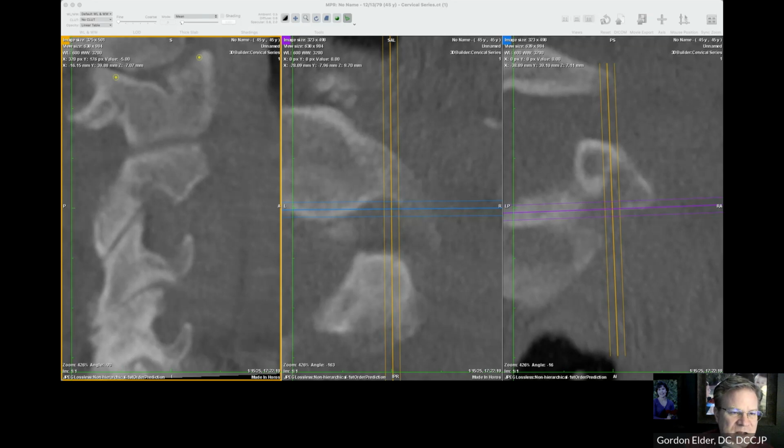Okay, Ryan. Sometimes the 3D on ours doesn't end up this crisp. I found it typically older people or people that are heavier set. Is there a setting on taking the CBCT that can change that? I've tried some experimenting with changing the voxel. So there are different sizes. Voxel is the 3D pixel that we measure the slices in. And you can change that. I try to get as detailed as possible. And the machine, like a lot of the digital x-rays, kind of picks the best one, especially if it's designed that way.